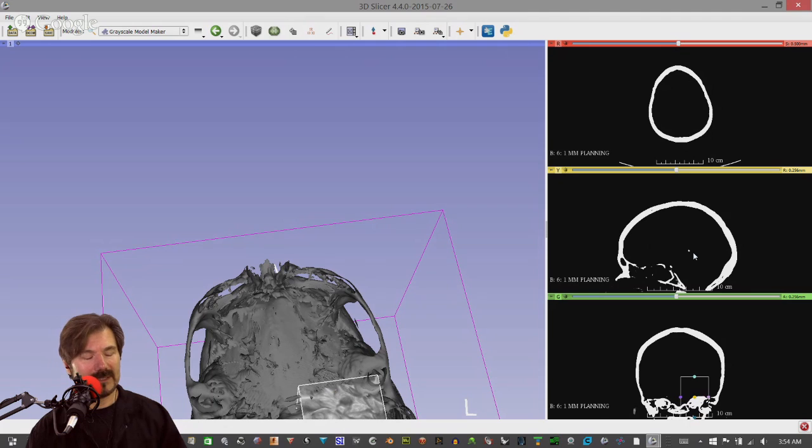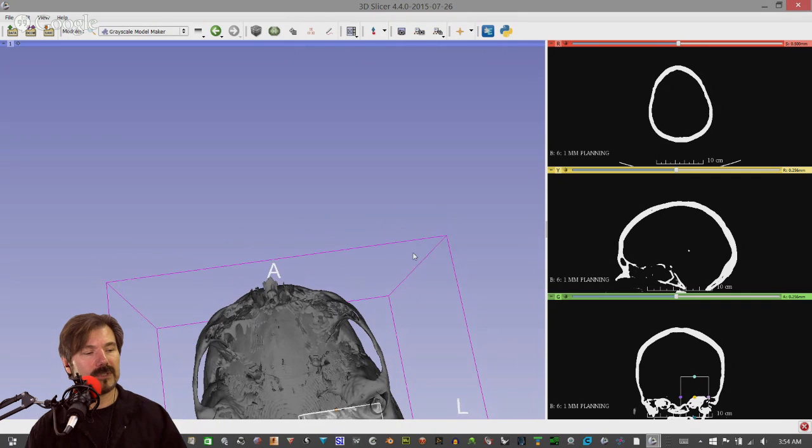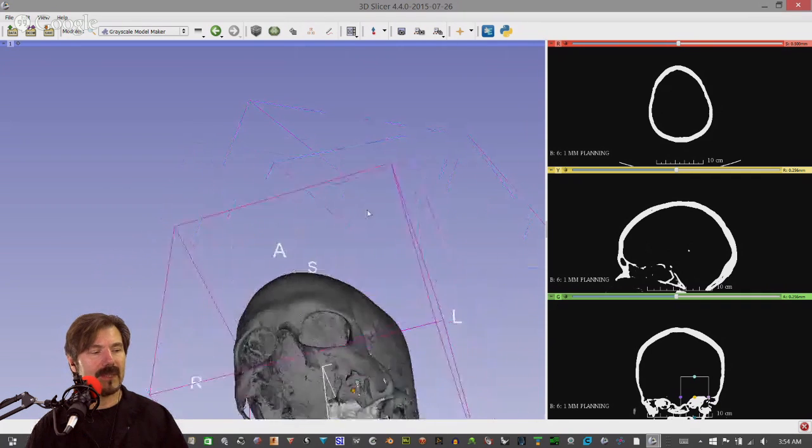Now, there's a couple ways of doing this, and obviously with 1mm slices, I don't remember how many are in here, but let's say there's like 300. You can either clean them up individually, or you can assign a region and just say go through all of them, which is a positive and a negative, because if you go through all of them, you actually go through the outer surfaces too, but you can assign how many you want to go through. So it automatically will go through and clean up a region interior in the internal portion without touching the outside.